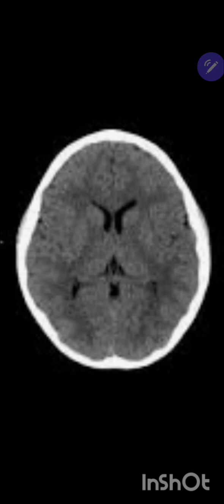In the mid area, the whole internal structure at the different sections of the brain, with different spaces and parts, the thalamus body, the ventricles gap, and other structures.